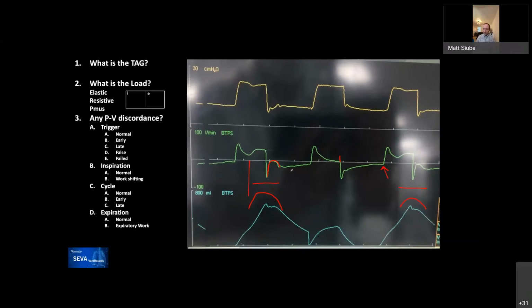And then the other comment is that reverse triggering doubles the tidal volume, and that would be true if it triggered a second breath. In this case, we're just seeing an inspiratory effort that didn't actually trigger a second breath, but sometimes you will see it generate a second breath, and you'll say, oh, they're double triggering, which again is a pattern. It doesn't tell you why it's happening, and then it's up to you to decide. I think there's a valid point there, Matt.